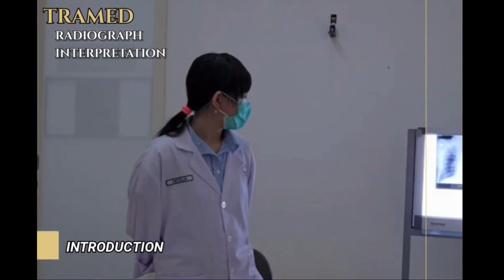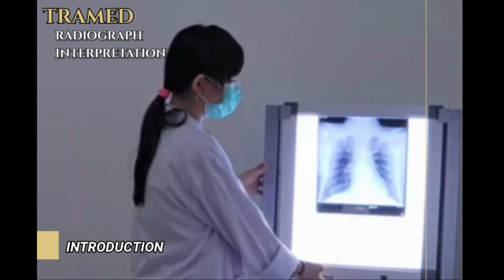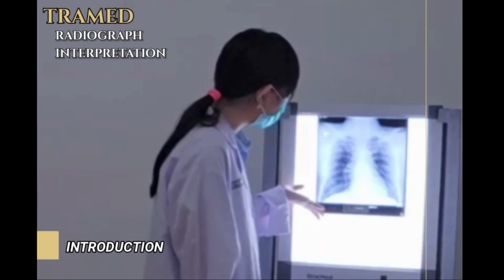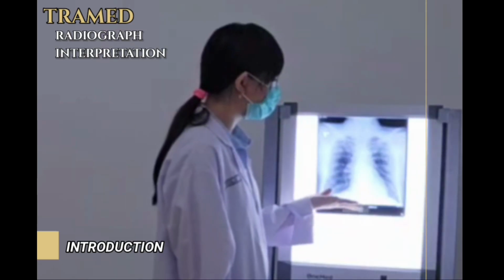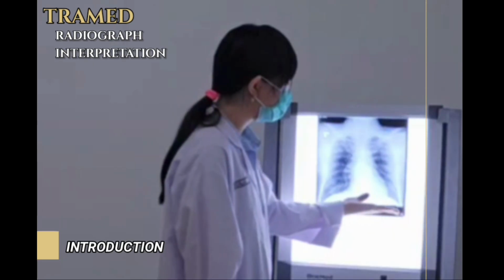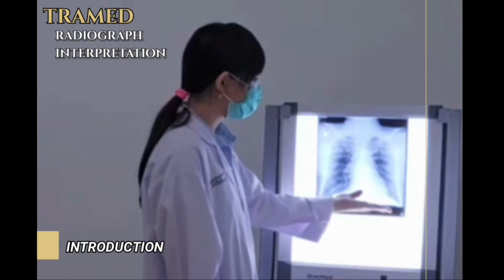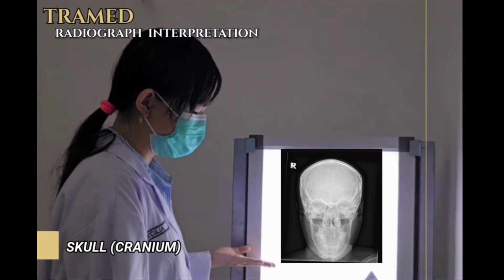So image radiograph is also the skill to establish the diagnosis of the patient. And after that, I must place the radiograph in the radiograph box like this, and check. Then there is no name, but the age is 56 years old, a man, and also the date of the radiograph is 26 December 2016 at 12:50 a.m.